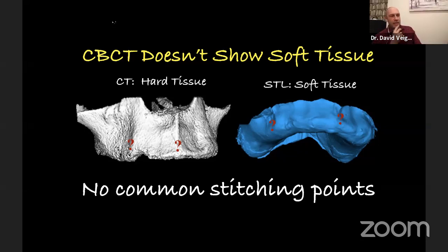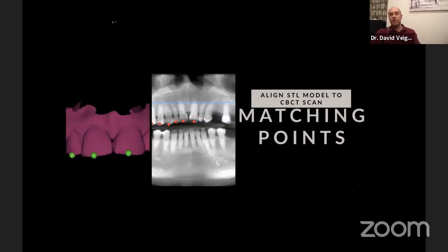I used to use ball bearings. So 5mm ball bearings. Now, the problem with the ball bearings is they themselves produce scatter. So when you're stitching the two data sets together, the scatter on the ball bearings doesn't allow the stitch to be really, really accurate. So BlueSky Bio have come up with some really nice little glass beads, and they're 1mm glass beads that are stuck onto a sticker. And you can use that on any of the surfaces that you want to use the radiographic markers on. I'll show you that.